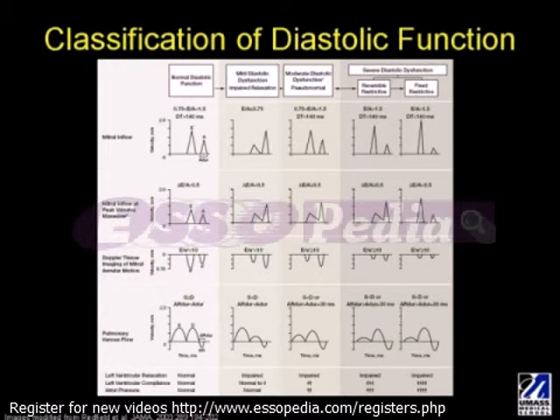Now, stage 2 diastolic function, or pseudonormal, you see the mitral E wave, E deceleration time, and A wave, and the E to A ratio appear normal. This occurs because the LA pressure begins to rise gradually as the filling pattern transitions from an impaired relaxation to a normal-looking filling pattern. The mitral E wave increases. We shorten the E wave deceleration time with left atrial filling.